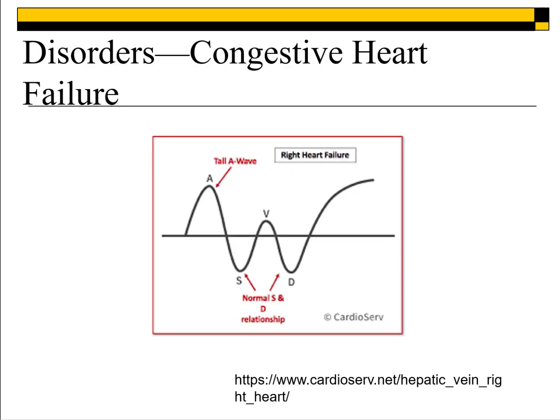It's important to remember that congestive heart failure and TR commonly coexist together. But just to recap, in a waveform where congestive heart failure exists and they have a competent tricuspid valve, we expect to see a pulsatile waveform, overly tall A wave and V wave, and that A wave is due to increased backflow because that failing right ventricle is not able to accommodate the entire amount of blood from the right atrium that's contracting. So we get that overly tall retrograde flow during atrial contraction, and also our V wave.